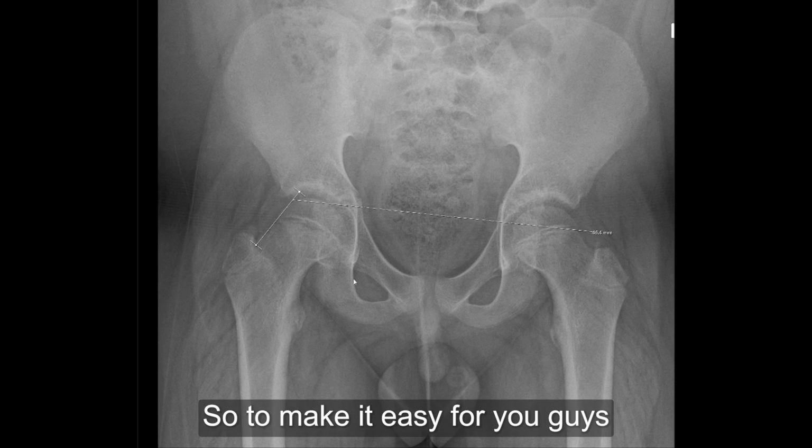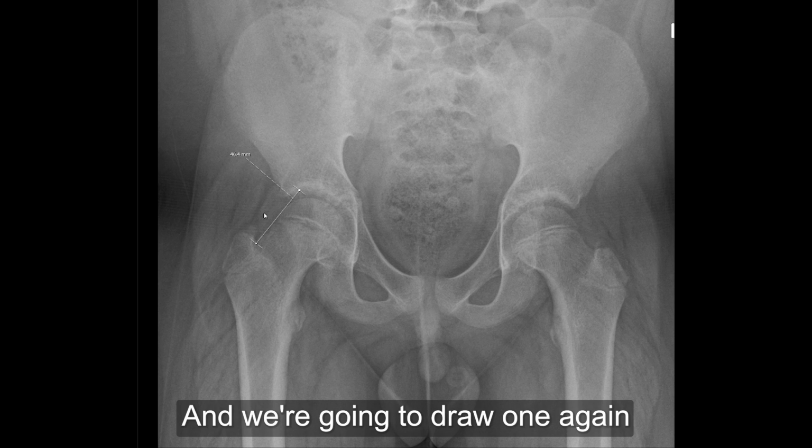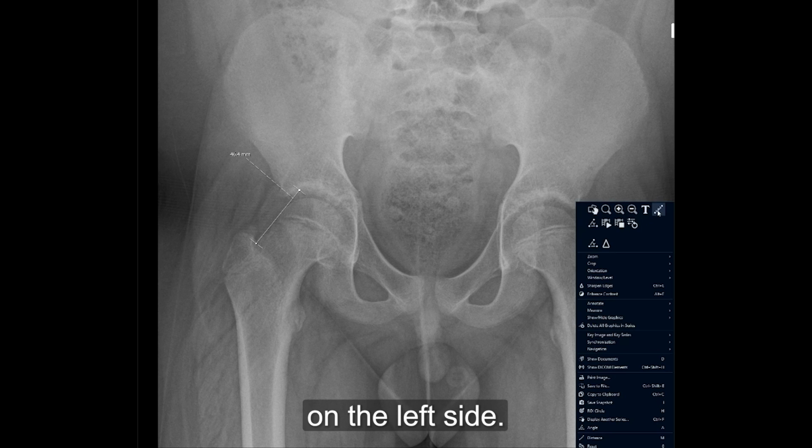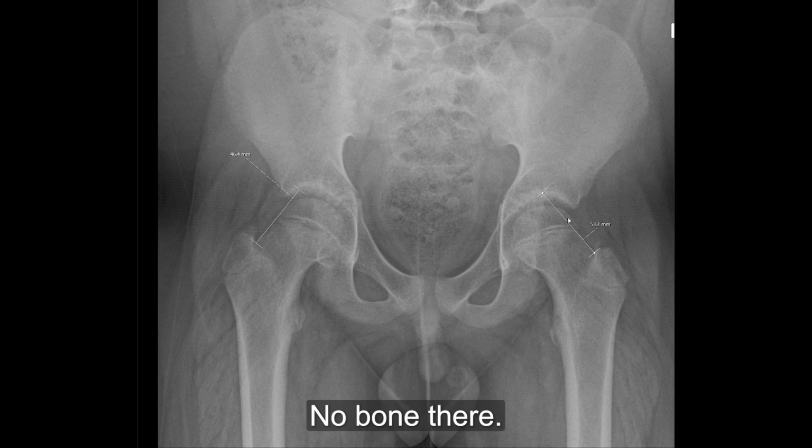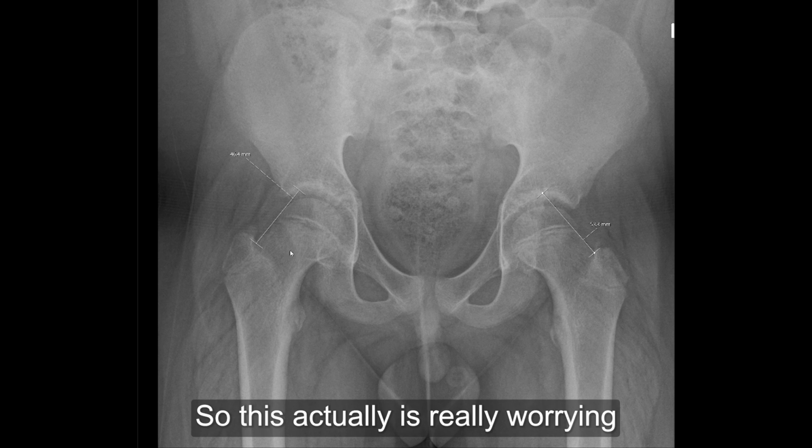To make it easy for you, here we go. This is the right side and there's no bone. I'm going to draw one again on the left side. And you could say that's not really aligned, but if you get it down here, it's even worse now. You see a bit of bone here, no bone there. So this actually is really worrying and concerning.